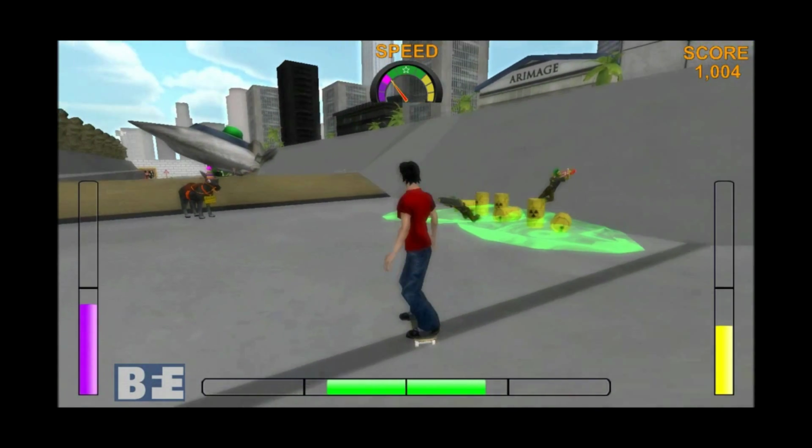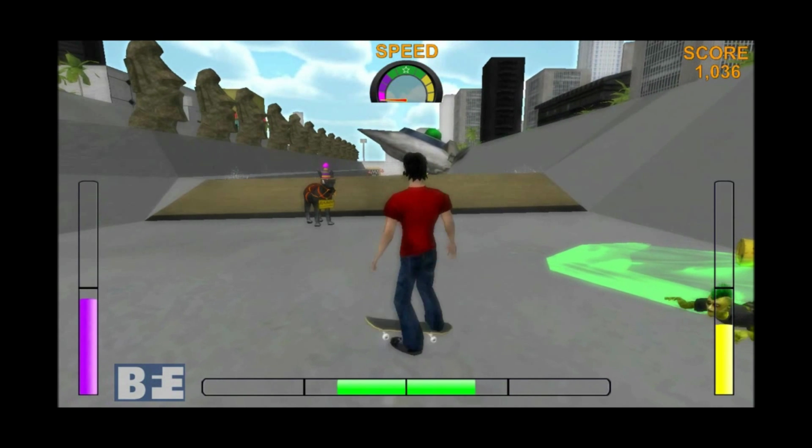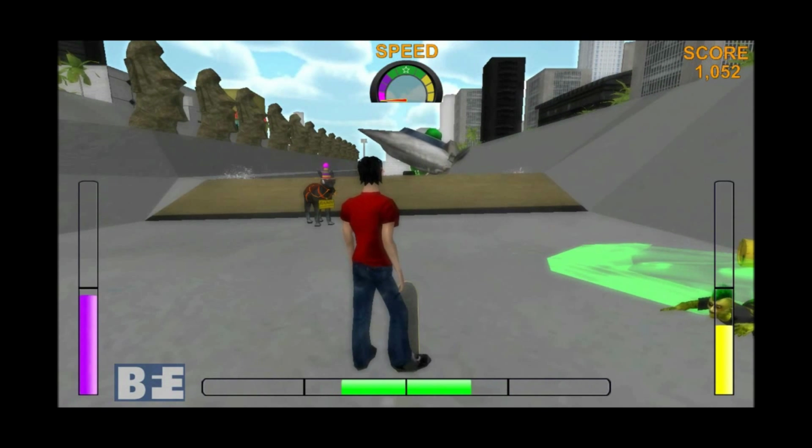And so once the client stops correctly self-regulating such that the low frequency goes below the set threshold, their little skateboarder character stops moving and they no longer gain points as quickly. This game really does reinforce the idea of heart rate variability or neurofeedback training, because they really want to get their character to move forward, they want to amass points, they want the tricks to happen and see more effects.